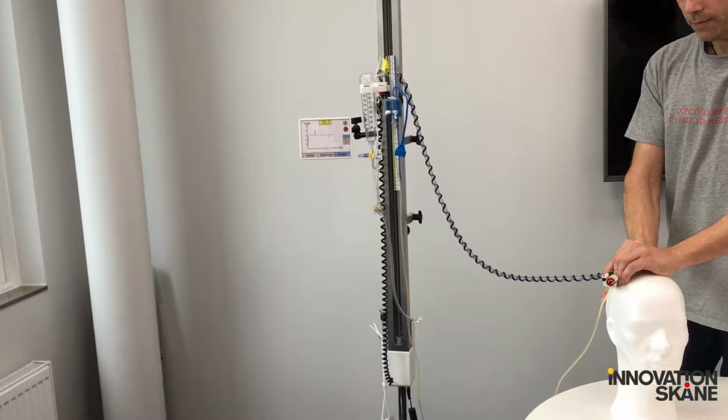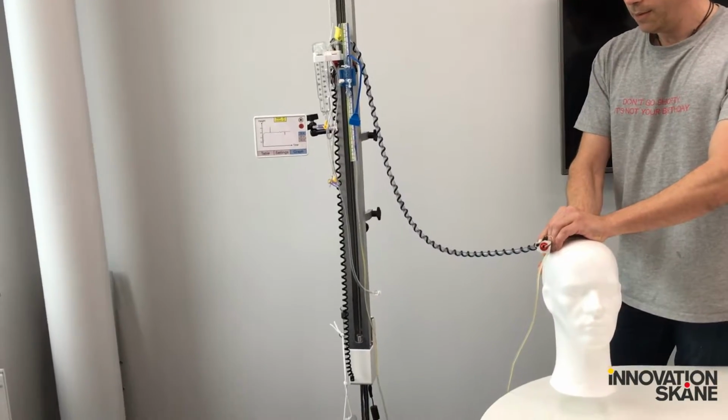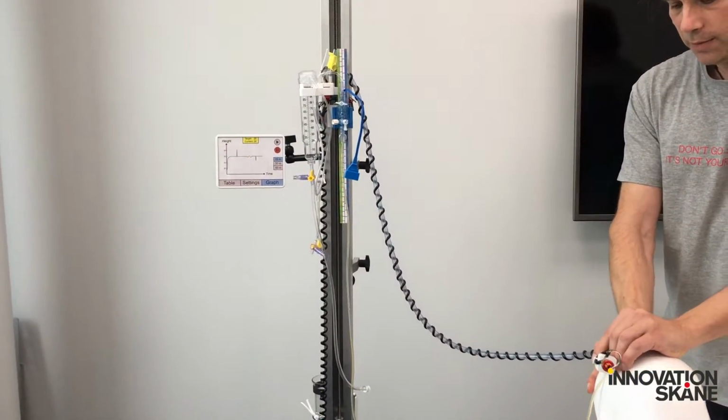Let me demonstrate. The patient comes down and the outlet of the drainage follows.